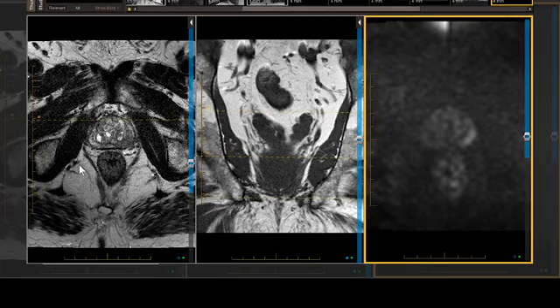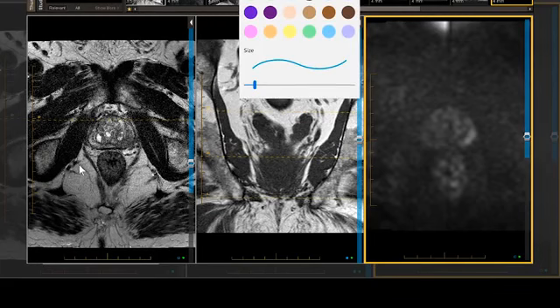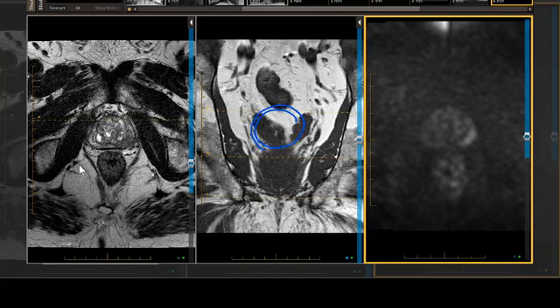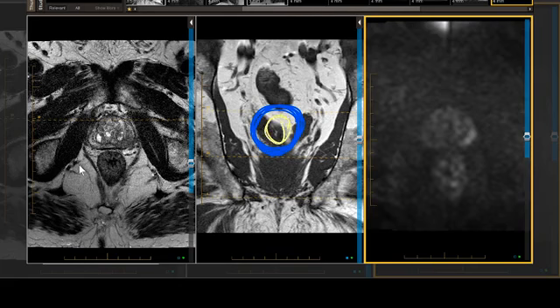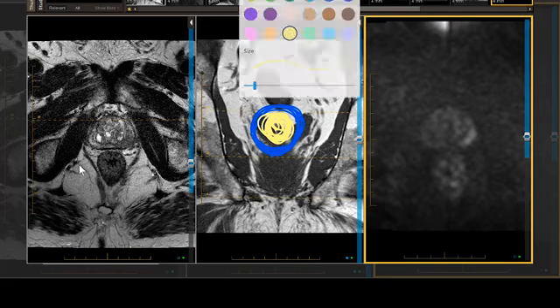So let's draw these donut signs. An abscess, we're going to have lower signal intensity around the outside on the DWI, say B1600, and on the inside where there's hyperviscosity, it's going to be bright. That's our vanilla donut sign. If we've got a tumor, it's going to be the opposite.